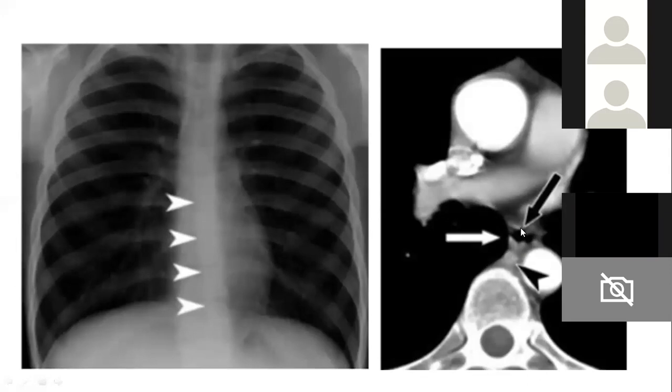If the esophagus is filled or dilated with air, instead of a single line, two parallel lines can be seen. That is okay. That only tells you that both the esophageal walls can form each line. If this is displaced, it is likely due to a displacing or thickening mediastinal mass.